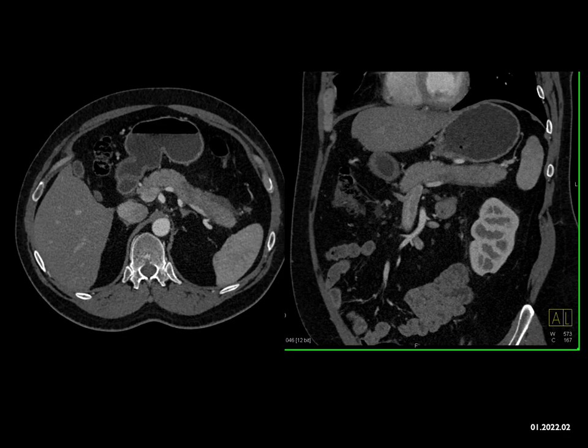But then you would say, if I had pancreatic adenocarcinoma, I would have a dilated pancreatic duct, and I don't have that. Also, when you look carefully at both the axial and coronal views, you see low density around the gland, very much an indication there's local inflammation. And it's true you can get pancreatitis and carcinoma together, but I'm really focusing on the fact that I don't see a dilated duct, and I have what I would call a halo around the gland.